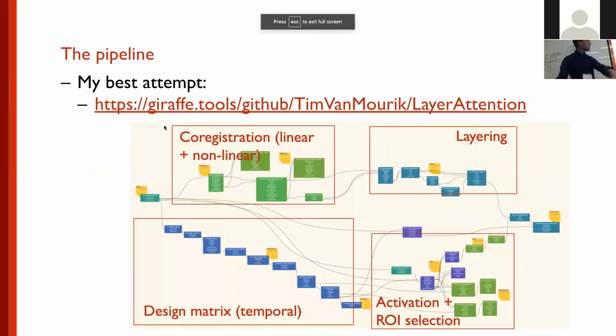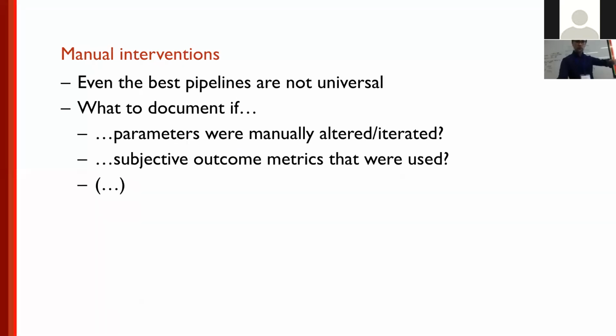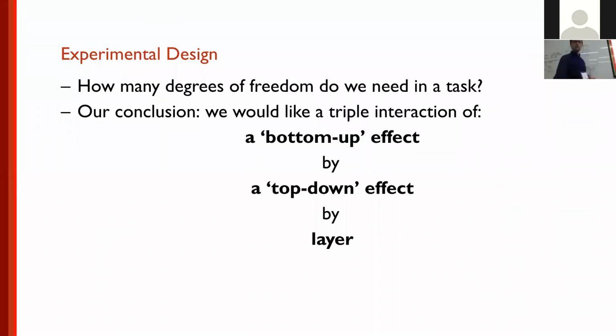Let's see, these are still some boxes around the different parts of the pipeline. I was just talking about this, right?